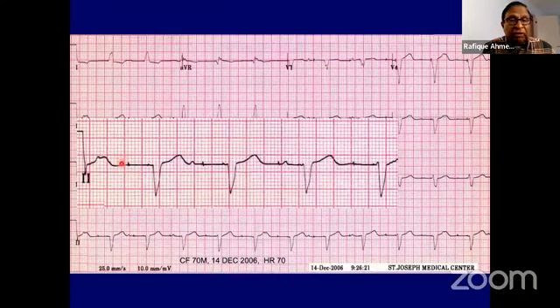There is an atrial pacing spike and there is no P wave. So clearly there is failure to capture the atrium. Sometimes you can see it if there's a P wave just before it, but this one, there is a P wave and it paces the atrium. That means it did not see this P wave. So there is failure to capture, failure to sense.